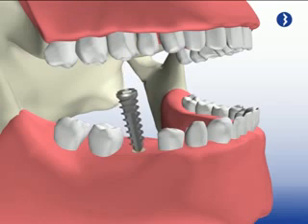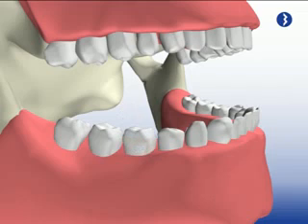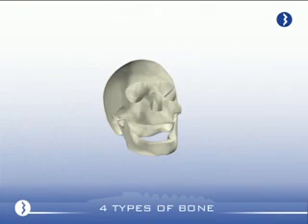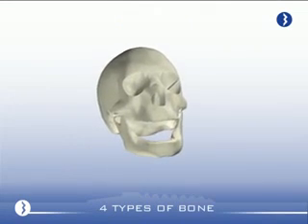The Trinon system should be followed by its design. Simple drilling sequence, implants, and according to the type of bone involved. Remember the 4 types of bone and the quality of osseous and their anatomic order in the jawbone.